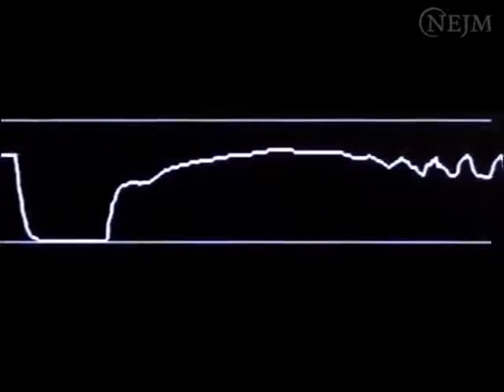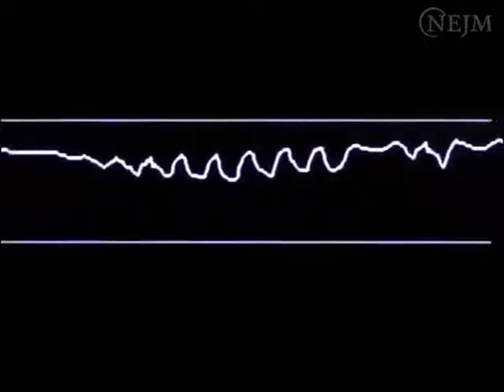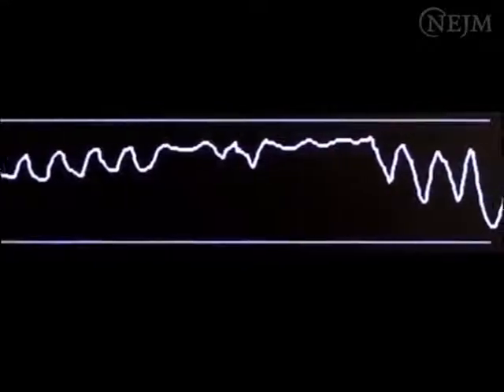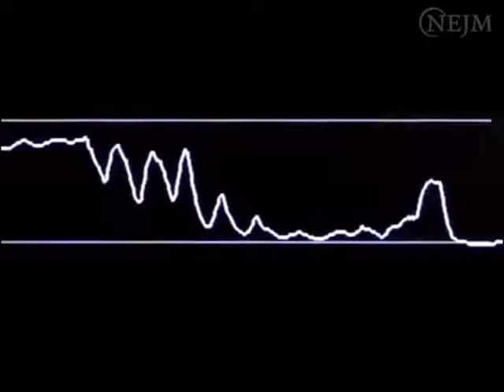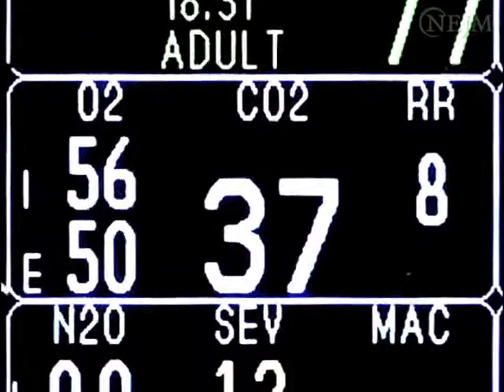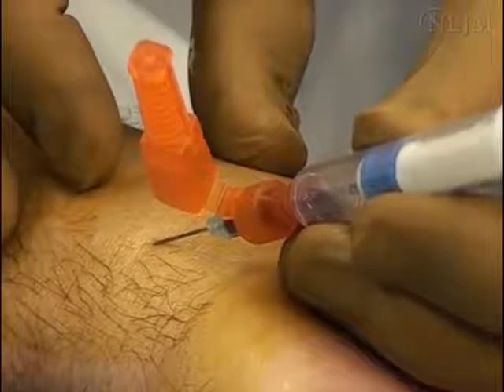Cardiac oscillations result from the transmission of cardiac movements to the lungs and airways. These oscillations are usually seen when either respiration is slow or the tidal volume is small. Such oscillations suggest inadequate ventilation, and a capnogram with prominent cardiac oscillations suggests the need to initiate assisted or mechanical ventilation. Although capnography provides a quantitative measurement of EtCO2, it is not as accurate as blood gas analysis for the assessment of the partial pressure of arterial carbon dioxide.